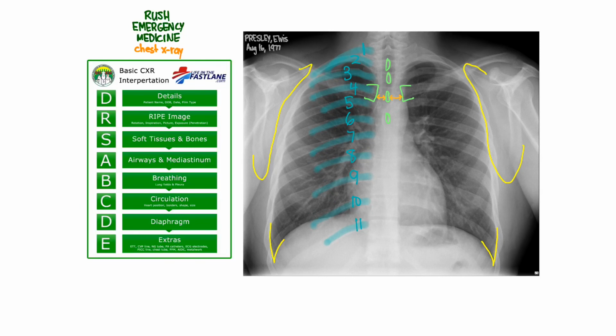And the E stands for exposure, and that means that we should just be able to see the disc spaces in between the vertebral bodies here underneath the diaphragm. And I think that's true. Like if we trace these, you can barely see them, and that's exactly what we want, that you can barely see those intervertebral disc spaces.